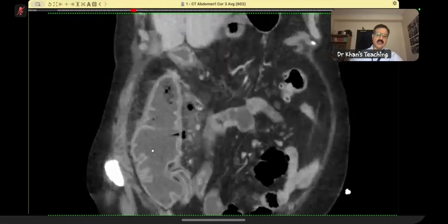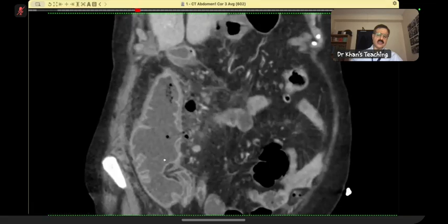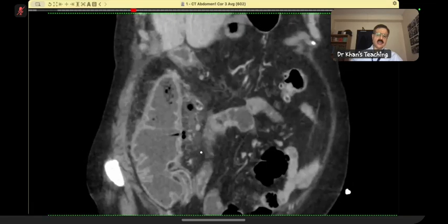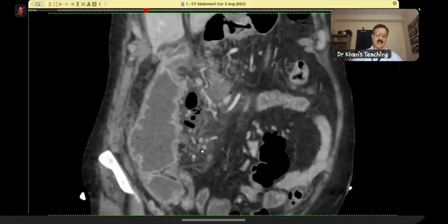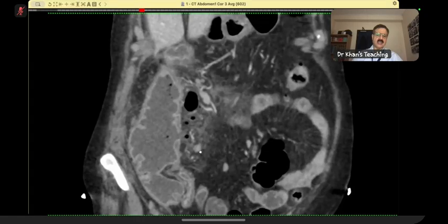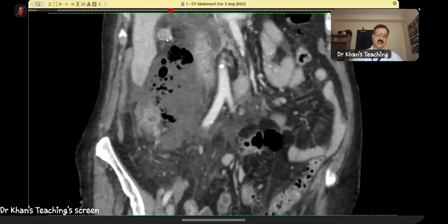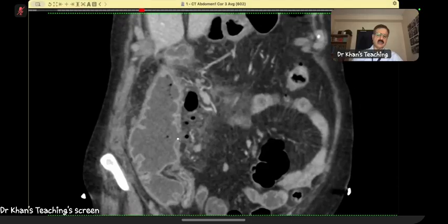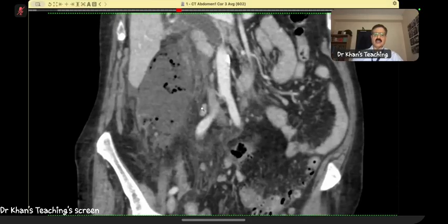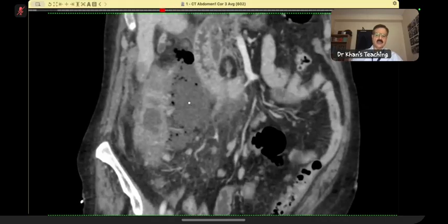And if you measure it, this is close to 5.8 to 6 centimeters. You know, of course, cecum up to 9 centimeters is taken as impending signs of perforation. This was less than that, but actually this perforated. So the etiology is interesting, and that is what this case is about. You see this and this, how it fistulates and how this makes this. Of course, there is biliary dilatation and all those things, but I was not interested. I was mainly interested here.